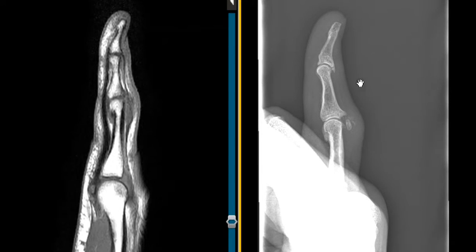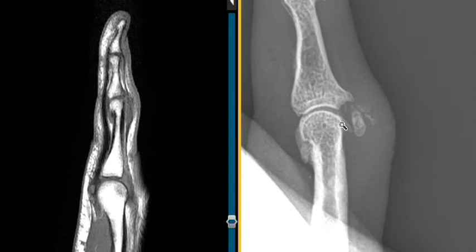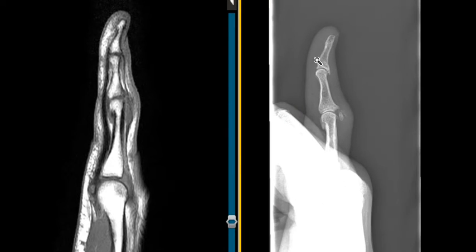And of note here in the x-ray, we see that there is this bone density over the back of the knuckle. So I'm going to zoom that on up here. So you can see this bone density here. This is in the region of an extensor tendon. The flexor tendon will make the finger flex down. It comes off here. Proximally, you can see it on this MRI.